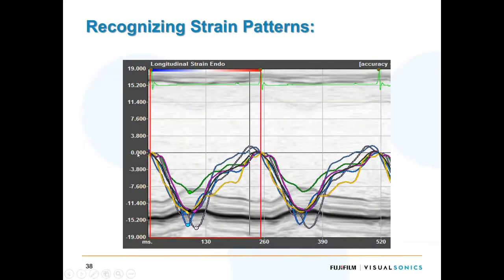If I look at this value, well, they all look like they're peaking at the aortic valve closure, so they're pretty similar here. But then when I look at the actual average, this black line, and then I combine that with the idea that this GLS is minus 13, well, what do you think that would be? This must be globally reduced strain.